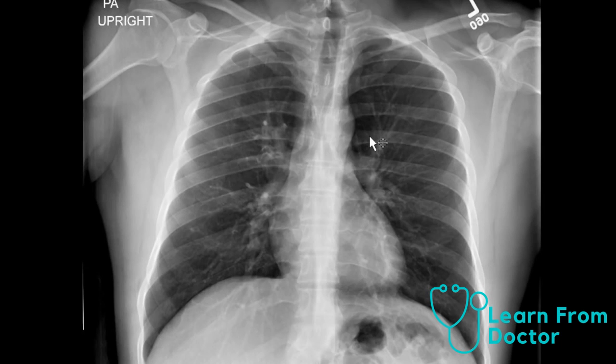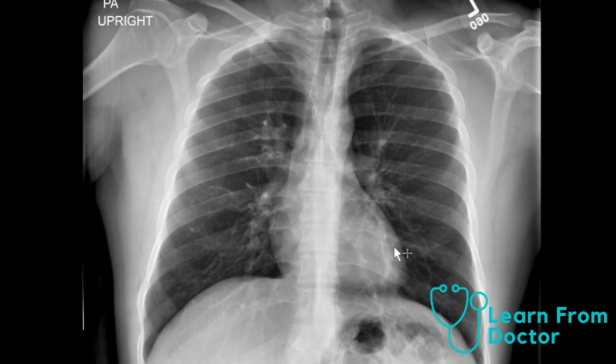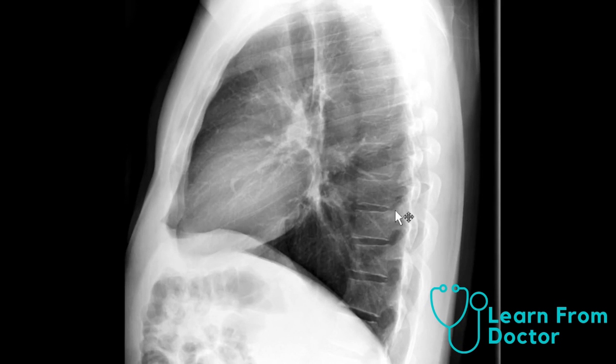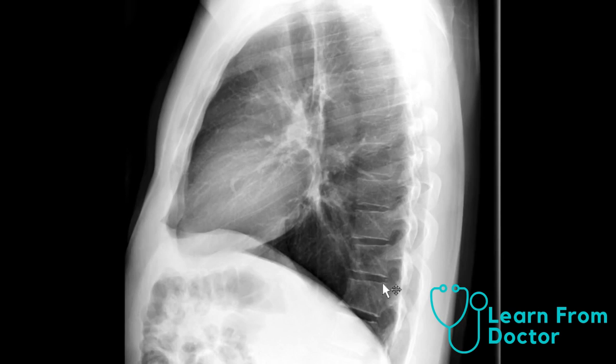So after I've cleared the frontal portion of the radiograph, I go to the lateral view if there is one. The lateral view is great for problem solving. If I see something on the frontal radiograph, I can always use the lateral view to kind of pinpoint where exactly it is. For instance, if I see something in this lung region and I look on lateral and it's down here, I would know it's in the left lower lobe.